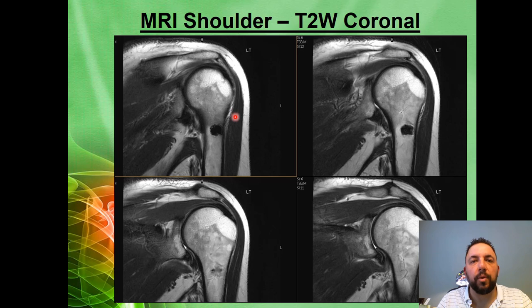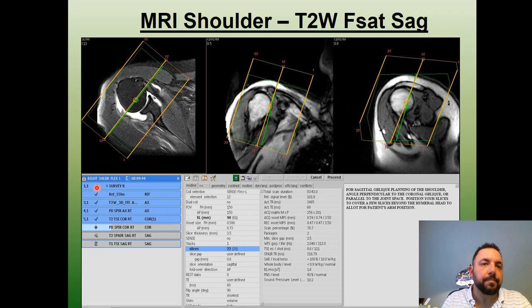In this T2 coronal as well, muscle is always dark on T2. Again, that J coupling, please don't look at fat being bright as an indication of, oh, it must be T1. As with fast spin echo or turbo spin echo applications, you can end up with brighter signal from fat than initially intended. This dark bony island here, but again, fluid will always be bright, indicating that this is T2, and muscle tends to have a darker signal intensity, indicating that it's T2 weighted.